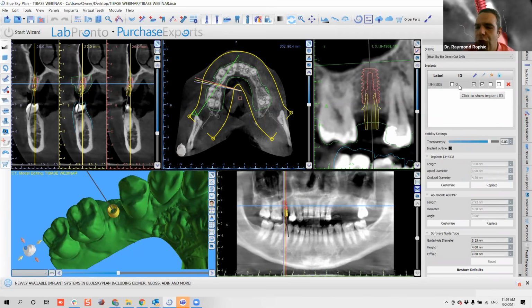Okay, and there are a ton of ways of doing implant planning. The way that I'll do it is first starting with the ID of my tooth, clicking the visibility on. Okay, let me answer some questions now that they're coming. Sorry about that. The custom healing abutment will be printed in one piece. Oh, I'm going to show you that. Yeah, let me finish the surgical guide.